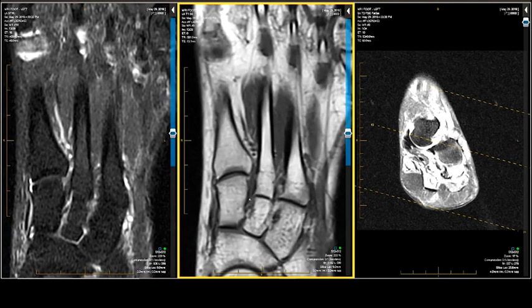Yes, I would. Now, it's a ligament, right? Why is it gray? It's not very wide, so if you call this a partial thickness tear / clinical Lisfranc sprain, I wouldn't argue with you at all. But you better tap into the fact that the Lisfranc ligament is not normal.